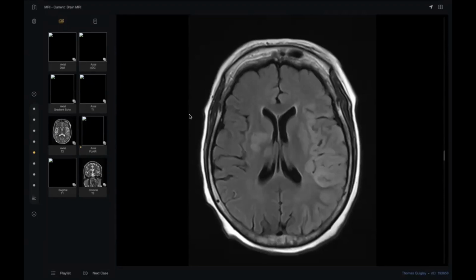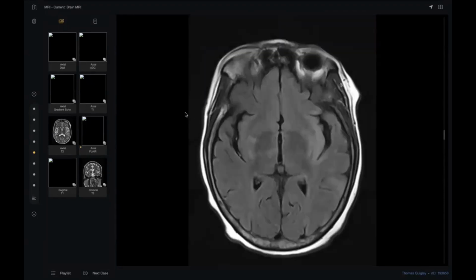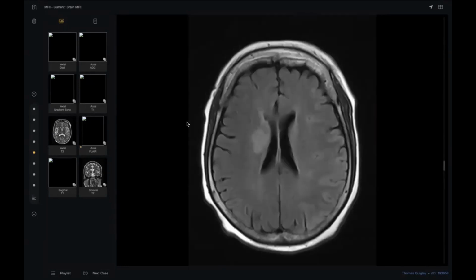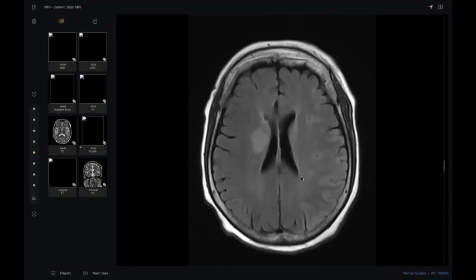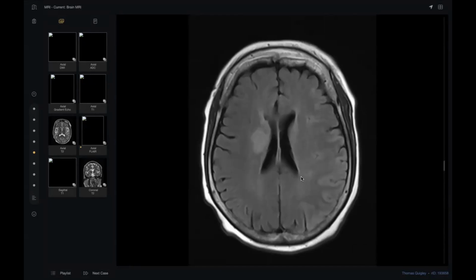What happened here? Infarction. A thalamic infarct. Okay. Where is the infarction exactly? On the right thalamus, basal ganglia, and internal capsule. What else? What about all of this? Yes, it is all abnormal high signal. So showering emboli. Excellent.